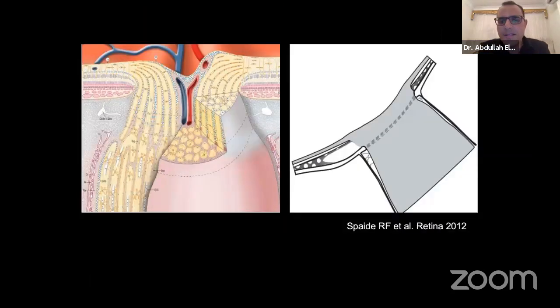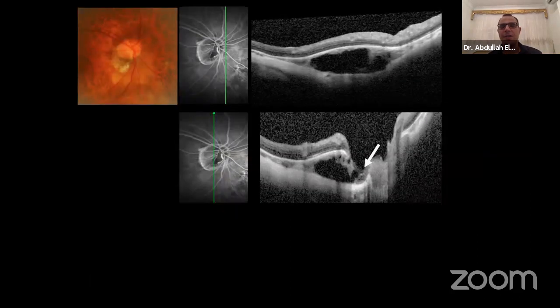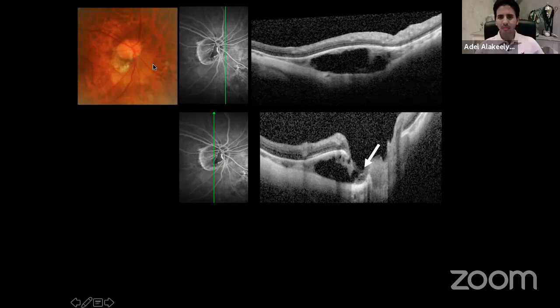Yeah, that's a very good question. Thank you, Dr. Malik. This is a very interesting change, the peripapillary choroidal cavitation, and definitely there is some change in the circulation. As I mentioned earlier, like in this picture, sometimes they may present with an enlarged blind spot or a focal visual field defect. You can see here within the area of the cavitation, more or less, the retina is not much affected, but in some selective cases, it may be connected to the vitreous cavity.